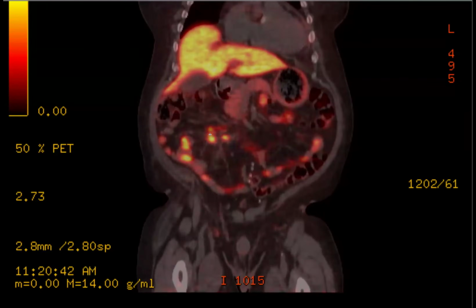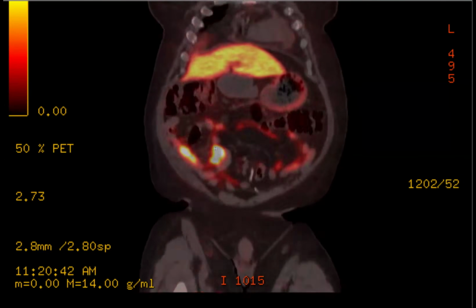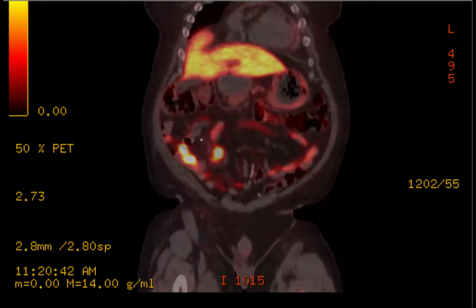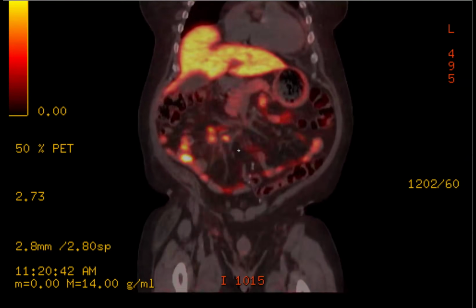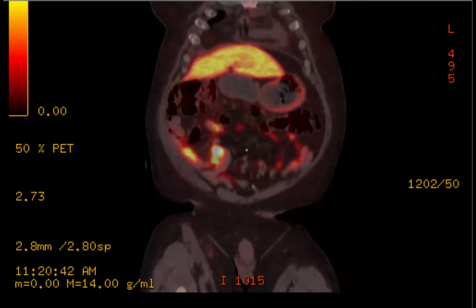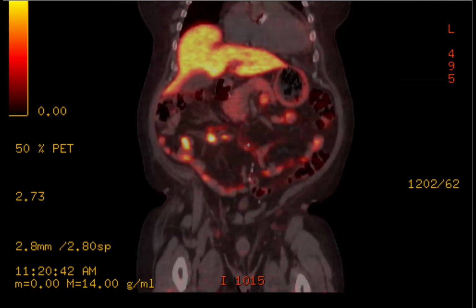So that mesenteric node was here, Rupa, lots of them. Multiple. And in addition, there's multifocal ileal carcinoids, which is the most common pattern, where there are lots of little ones. My surgeons were telling me that when they go to the OR, they palpate the bowel and feel all these little nubbins. Until they stop feeling the nubbins, that's basically how they resect. Then they showed me a specimen opened up and there were all these little tiny nodules.